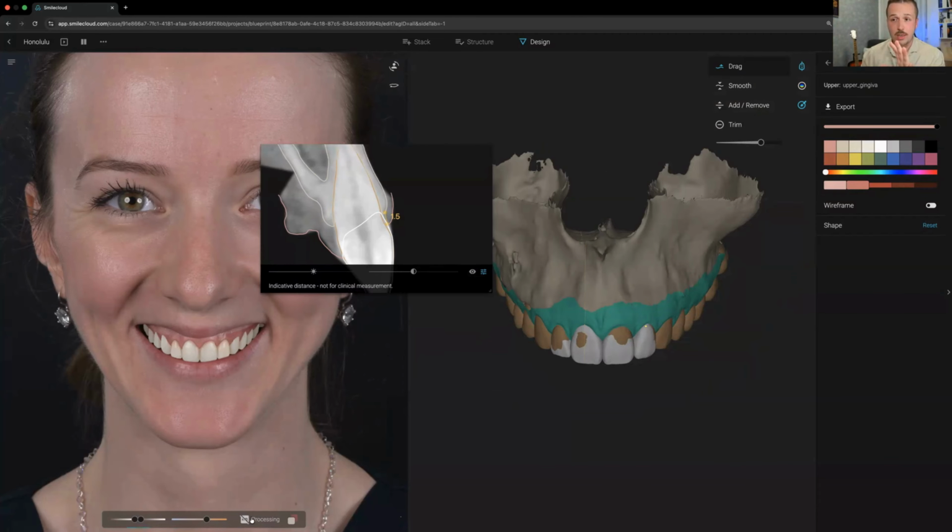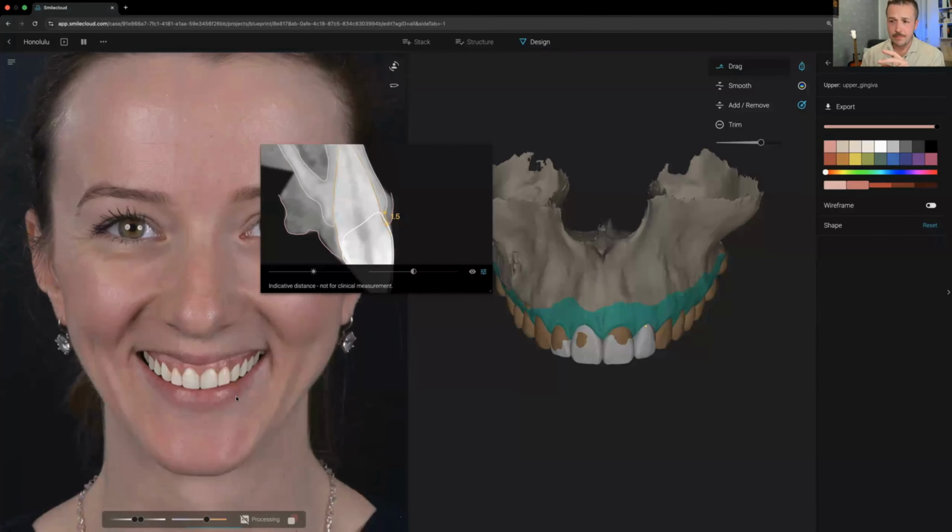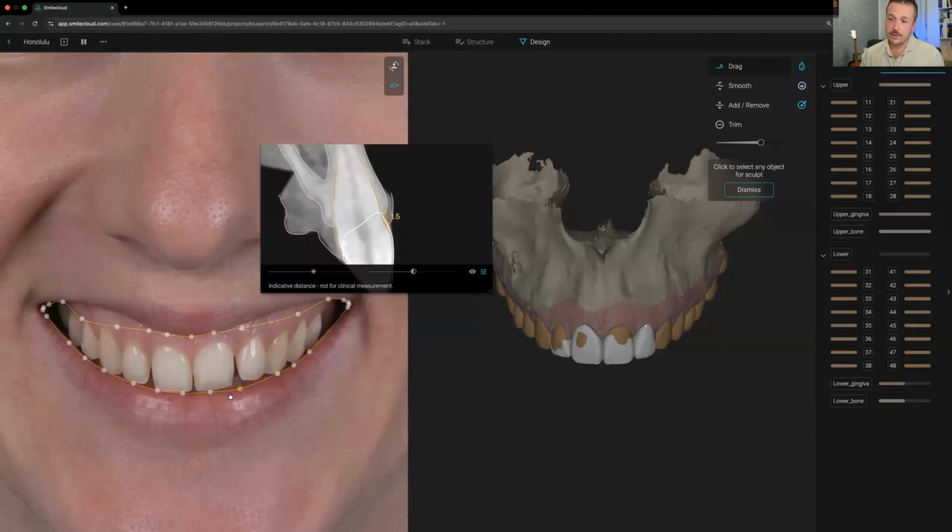So in this case, I'm also gonna do the HD design. And the best thing here is if you're doing the design with these full layers, if you're not designing teeth here, the render will show the patient's teeth, which are usually hidden underneath the gums. So in this case, we can actually see and compare before and after. And you can see actually this zenith of the lateral and on the right central moving a little bit. So this would be a really nice before and after case.